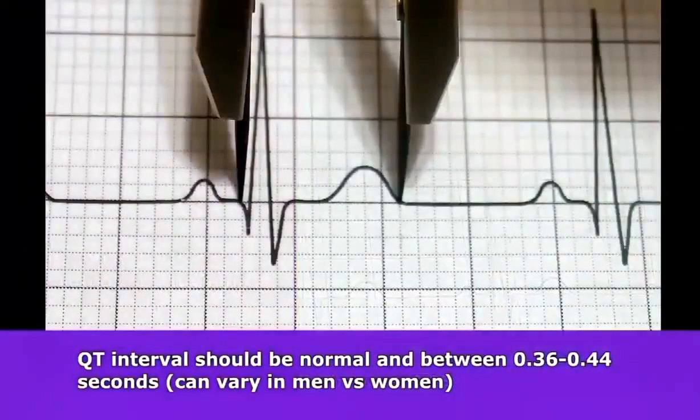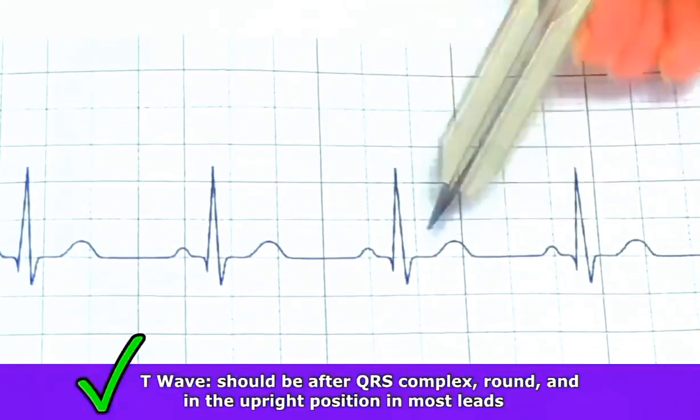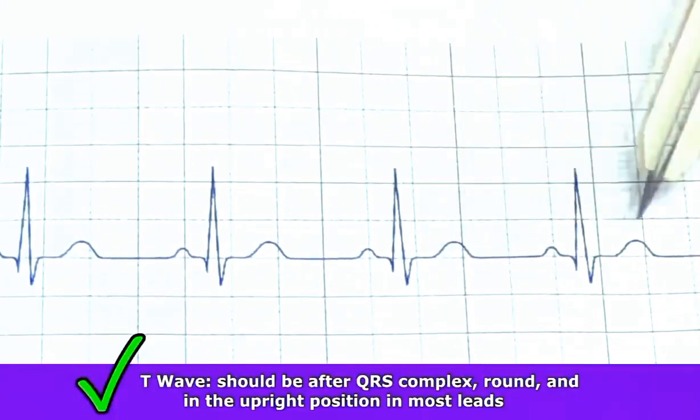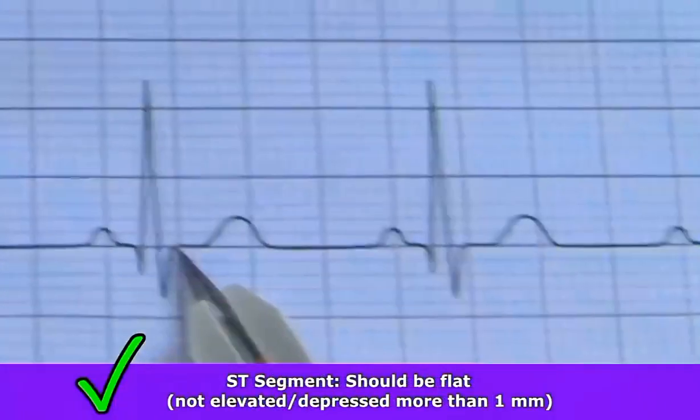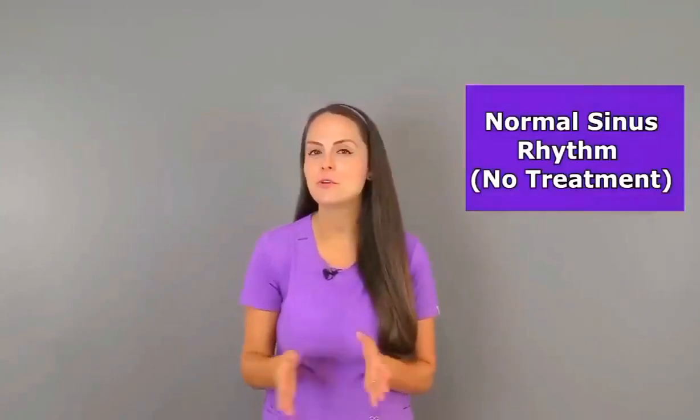There should also be a normal QT interval anywhere between 0.36 to 0.44 seconds, and there should be a normal T wave after each QRS complex that should be round and upright. And then finally, the ST segment should be flat, hence isoelectric. So whenever you're looking at your patient's heart rhythm and you see that they meet all that criteria for normal sinus rhythm, that is a good thing. This is a normal rhythm and it requires no treatment.